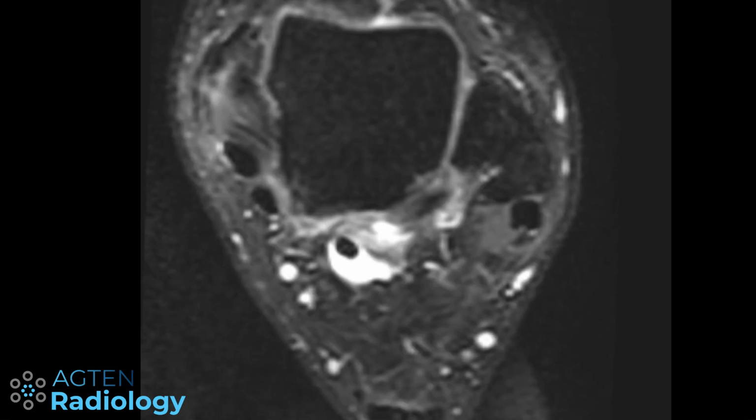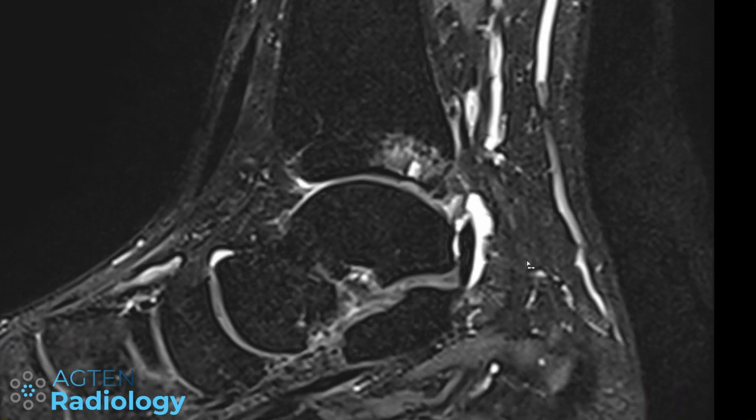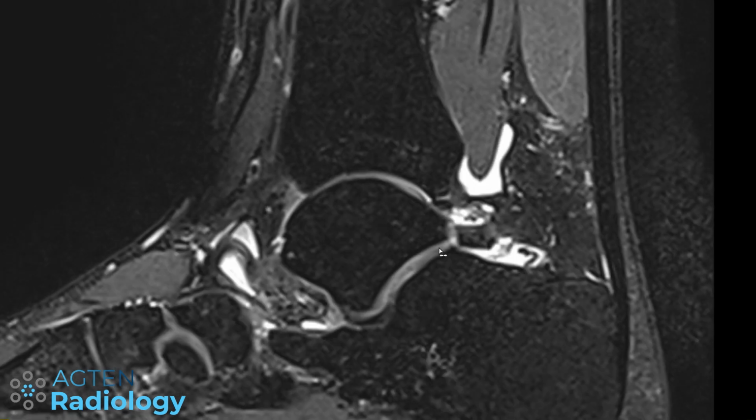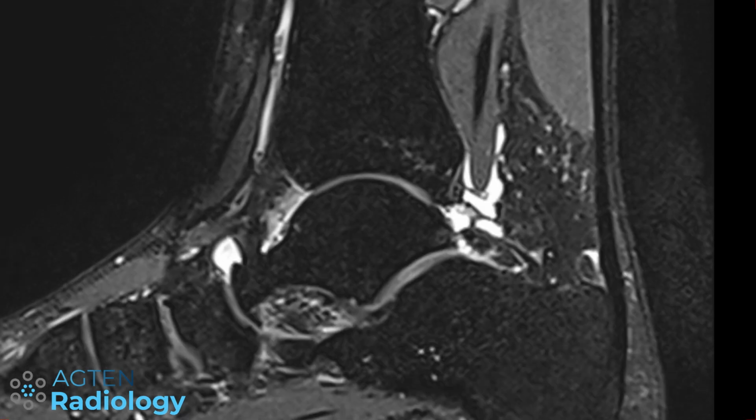So I'm really sorry that I don't have an actual case, but just look at the different structures that we went through, like these two ligaments, os trigonum or stieda process, some osteophytes, and make sure there is nothing else explaining these symptoms.